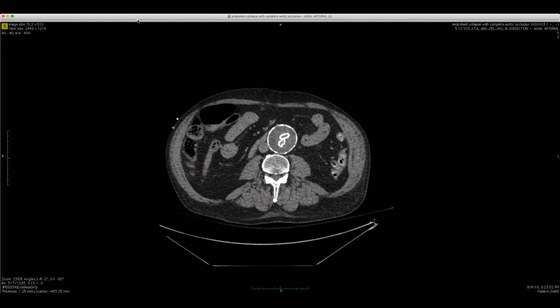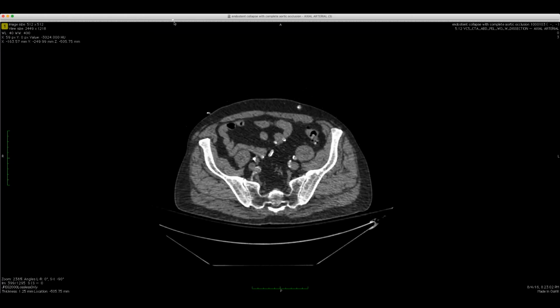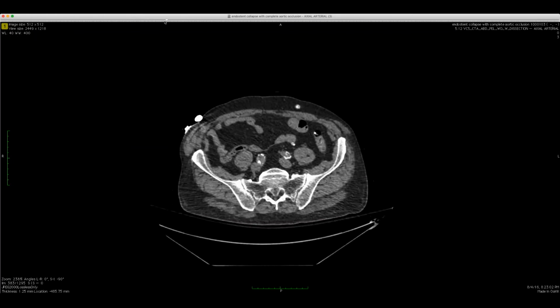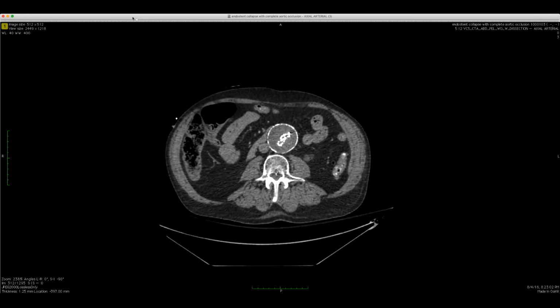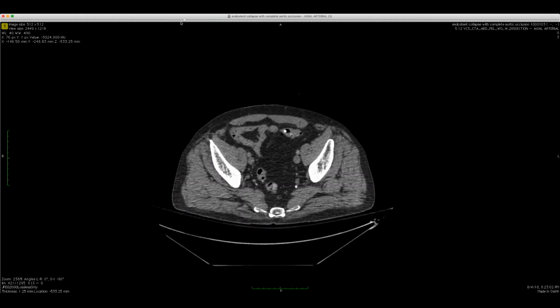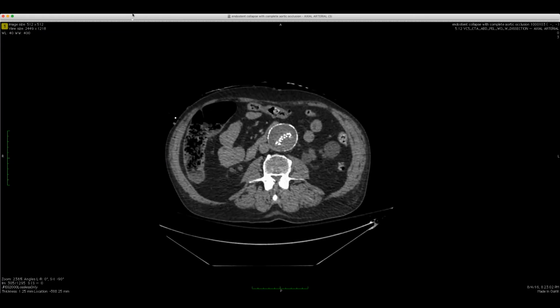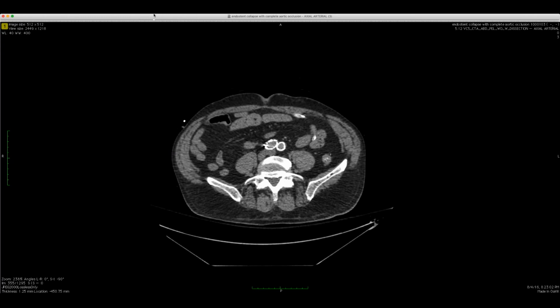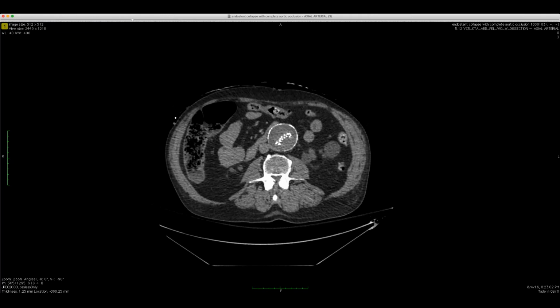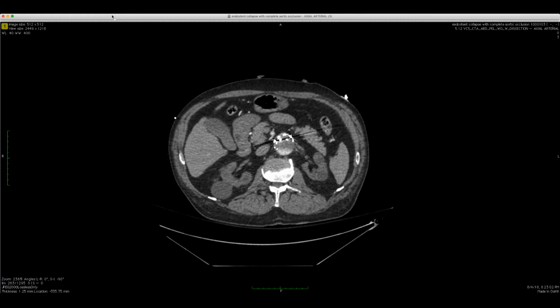And the aneurysm, of course, is still there, but the stent limbs are occluded, and everything distal to that is occluded. So he went emergently to the OR to see what they could bypass here, and they did a series of axillofemoral bypasses, and this was just in the last couple of days. I haven't checked to see how he's doing today, but apparently the extremities were just completely purple and ischemic. But this is really the most dramatic case of stent collapse that I've seen. I don't know if anyone out there has seen a more dramatic case, but I'm not quite sure.